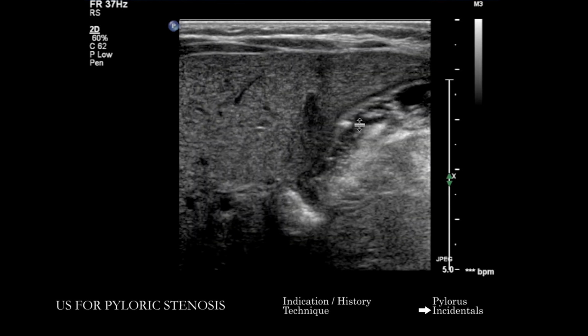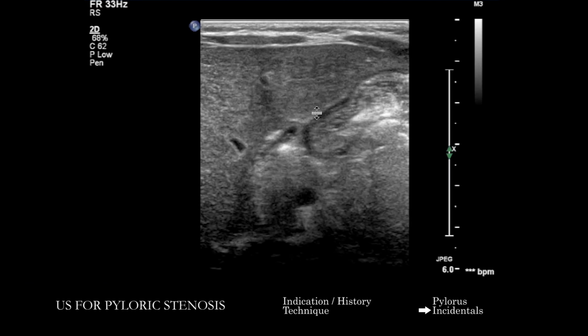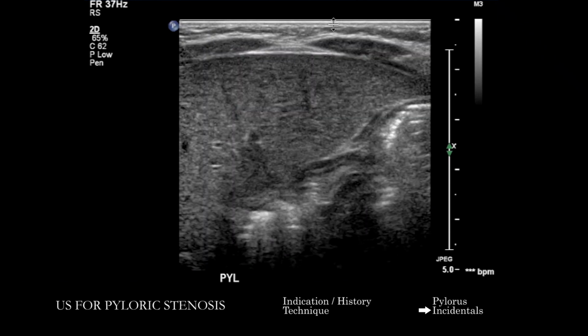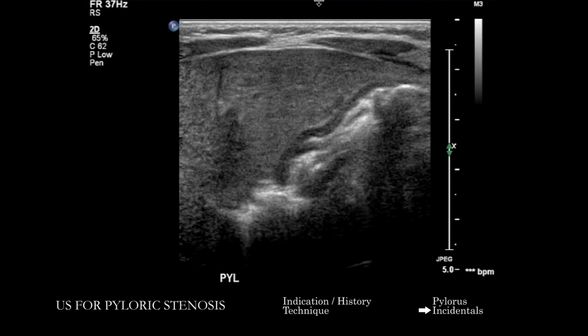These sorts of things are potential considerations in the setting of a presentation that gives you a sense of upper abdominal obstruction. So that's something to be looking out for on all the images as a potential alternative explanation if the clinical picture's not coming together with what you're seeing on the images. And you want to also be correlating with prior imaging and the level of clinical suspicion for various entities in doing that.